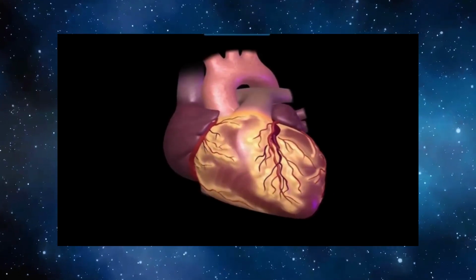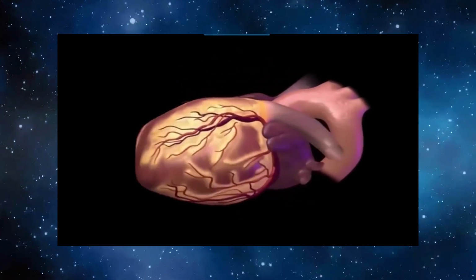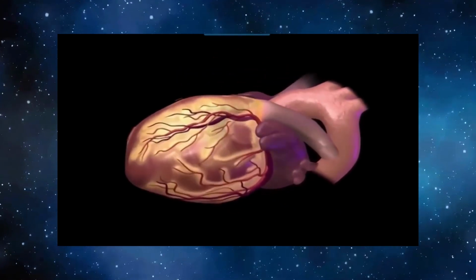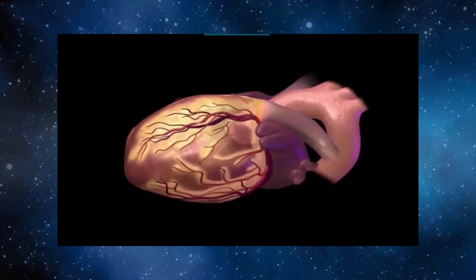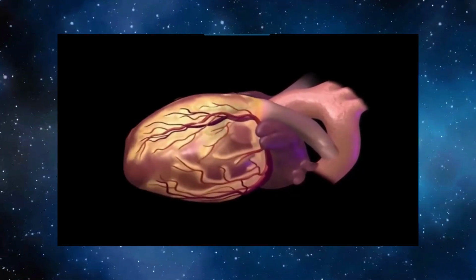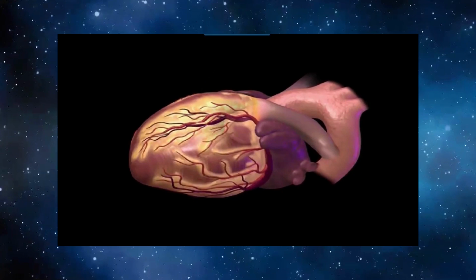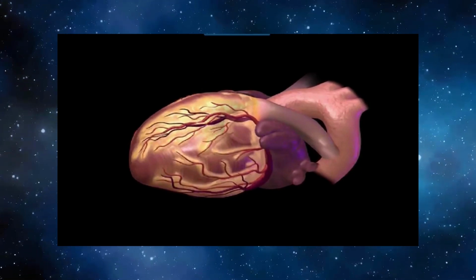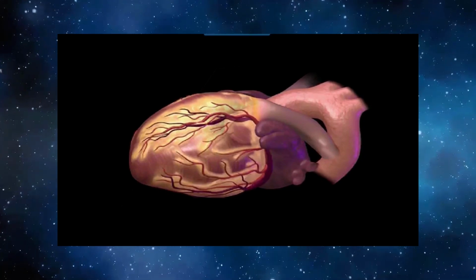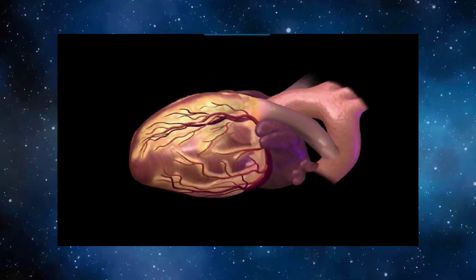As it turns out, the heart changes its shape due to a force. Therefore, we can actually talk about strain within the heart. And as it turns out, it is a really good way to quantify LV function. And we'll go over that in just a little while. But just keep the concept in mind that this is a way that we can quantify LV function both segmentally and globally.